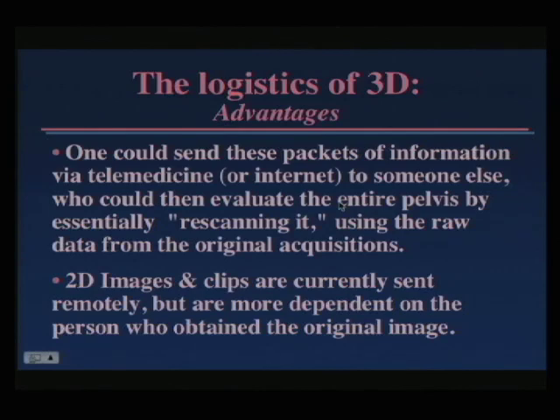Now, with 3D ultrasound, one can also send these packets of information, this volume, via telemedicine to somebody else who may want to reevaluate the entire pelvis and rescan it in a different way. Or you may be receiving the raw data from another place and may wish to rescan the pelvis slightly differently. This is very different from a video clip where you are really dependent on the method by which the acquisition was done.